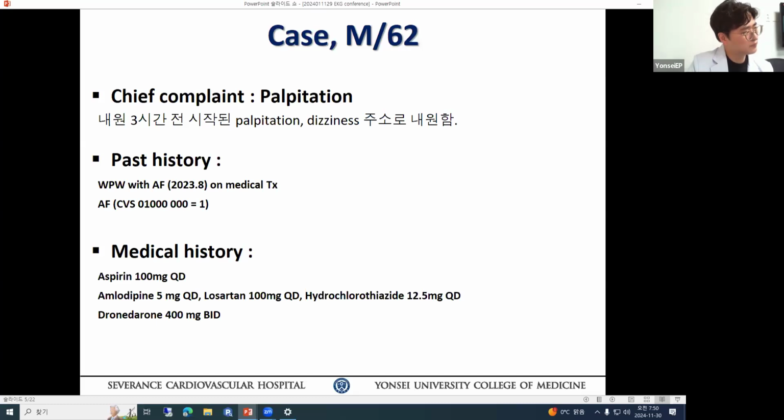There is no risk of sudden death, which is an important fact now, because not all posterolateral pathways carry sudden death risk. So the ones at risk should be managed at a young age. But given that the patient is uncomfortable, you should be ablating. Well, that's your answer. Agree. Any other different idea?